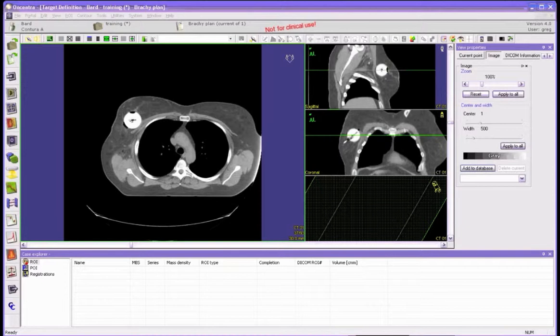Everybody. This is treatment planning for OnCentra using the Contura balloon, and we will be doing two separate cases here. We will do a simple case first that I have shown already, and when we finish this we'll make a separate presentation of a more challenging case.